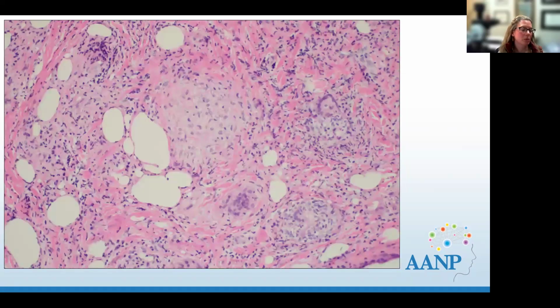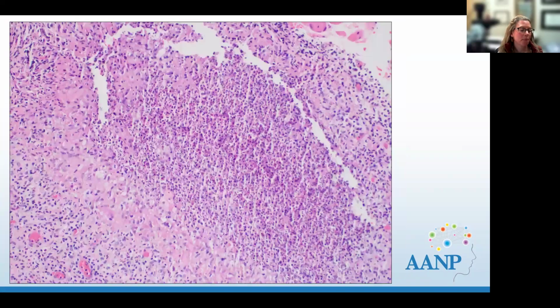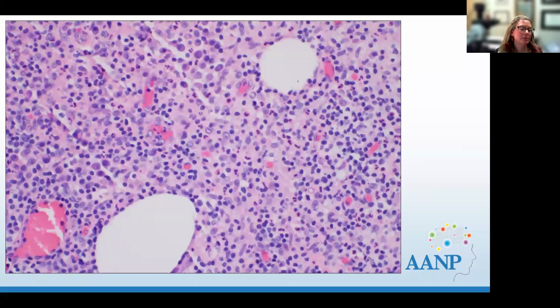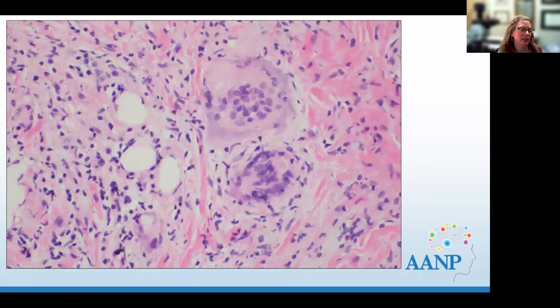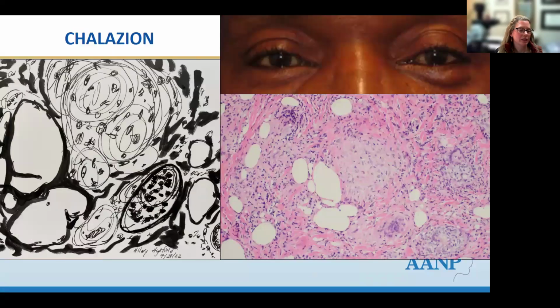And of course, the thing you need to worry about, here's that granulomatous reaction, is a sebaceous tumor. And they can have necrotizing granulomas. So if you see this, you may want to do special stains, but recurrent chalazion, probably not. Lots of necrotizing areas. And they're these lipid vacuoles that you look for. Okay, there they are. And sometimes you don't see that. I do a lot of recuts to be able to find it in the giant cells. So there's that graphic representation, and there's chalazion.